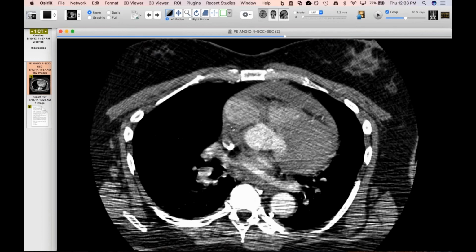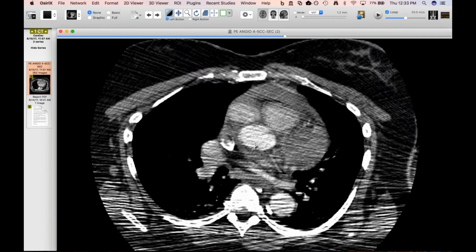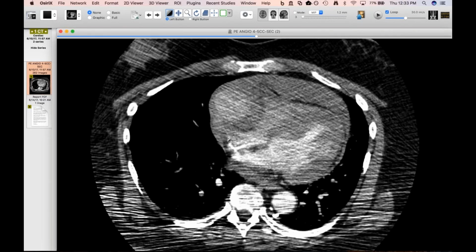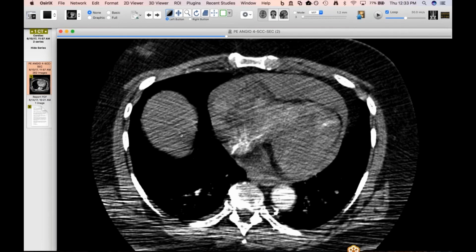We have no idea why she had it. She doesn't really have a lot of atherosclerotic disease. And I haven't seen the final path yet because this was just recently. But this is the first of these that I've ever seen with an aneurysm presenting with rupture of a coronary artery like this. I don't know. Has anybody else seen this? No. No.